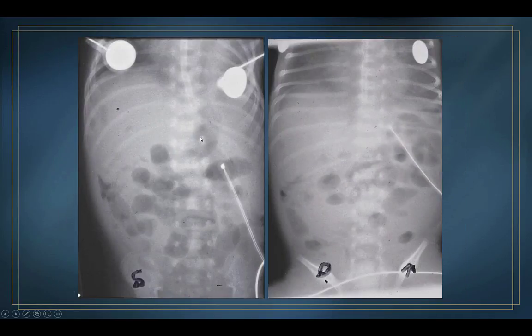Now, this is a bizarre case that I had, from the late 70s, early 80s. I lent these slides to a pediatric surgeon, and instead of giving me the originals back, he made copies, kept the original, gave me the copies back, and then wrote on them with a fountain pen. No radiologist in the world, if I was going to label an x-ray, I'd just use a soft lead pencil. So that's why this looks so bizarre.